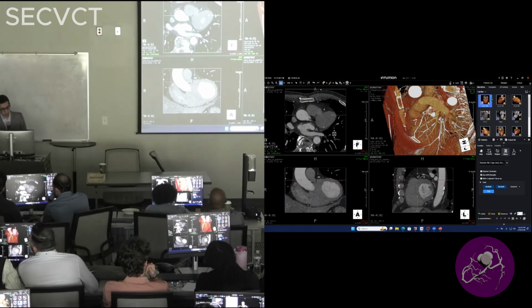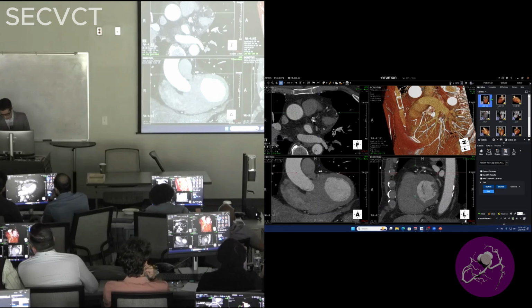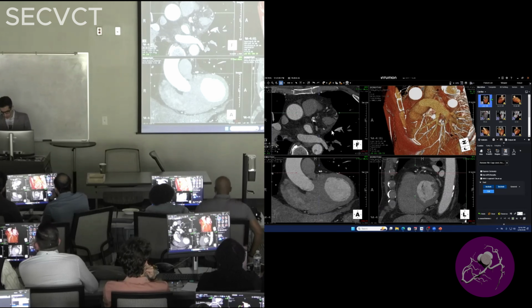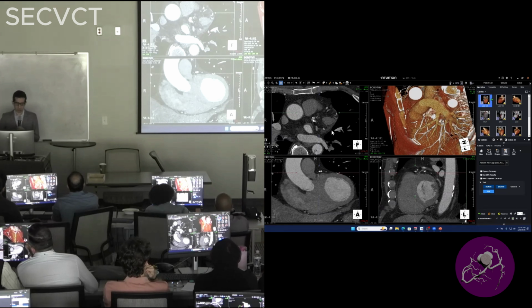The bottom line, there was extensive calcification. So this is one of the things we can talk about, how these patients with coronary artery calcification can be tricky sometimes to image, but more important to risk stratify. So a lot of calcification. His calcium score was about 914.